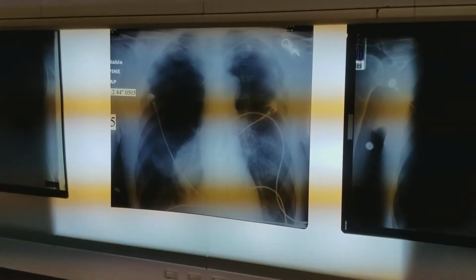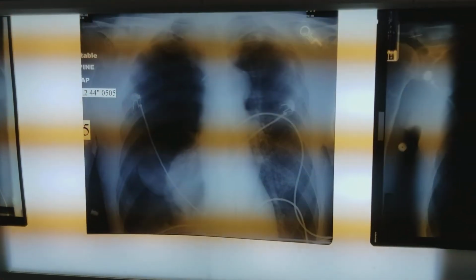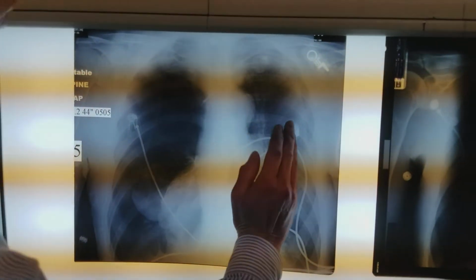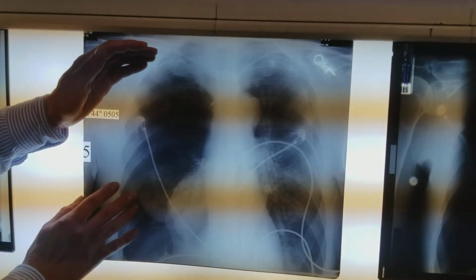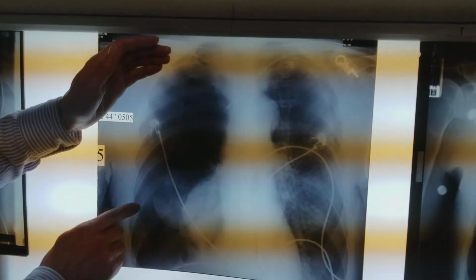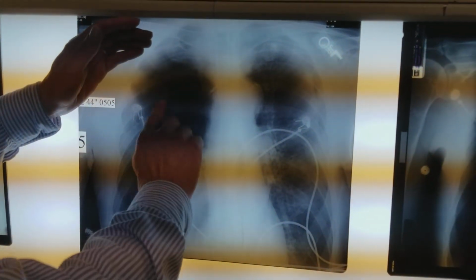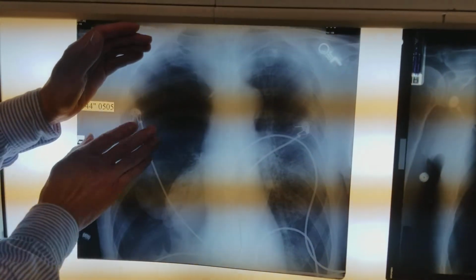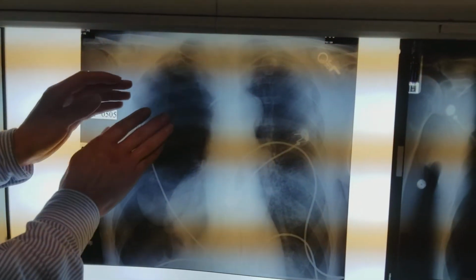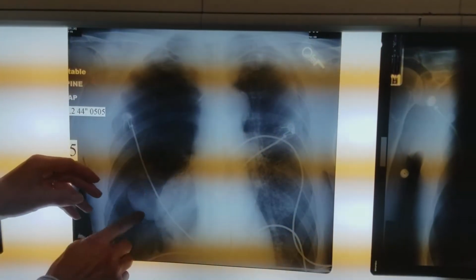And this guy is the dreaded pneumothorax. And so what you're seeing is you're seeing things get pushed away, and see how this is nice and really, really dark and clear here. You can see all the nice little lines, because there's no vasculature here, there's no lung. And so there's no lung markings except for right here.